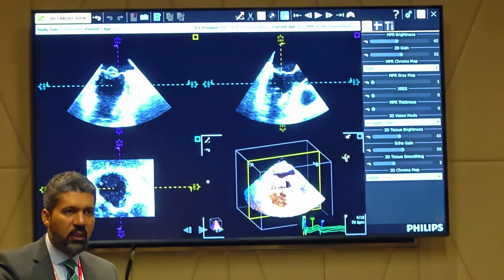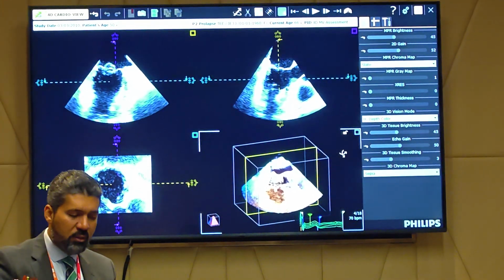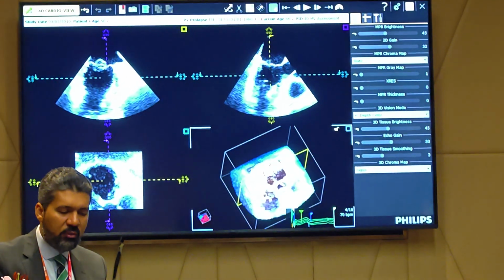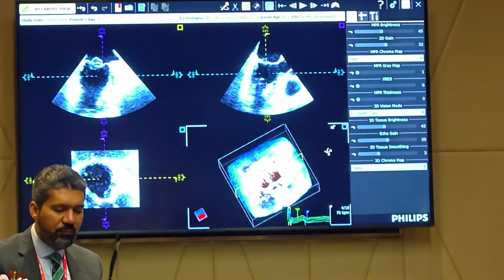Okay? Good. Now I need to flip the image, the 3D, to see it. Look at me first. Do not touch the 3D image. Go for the dark area here, click and hold and then flip it like that. Do not touch the 3D image itself. Okay?